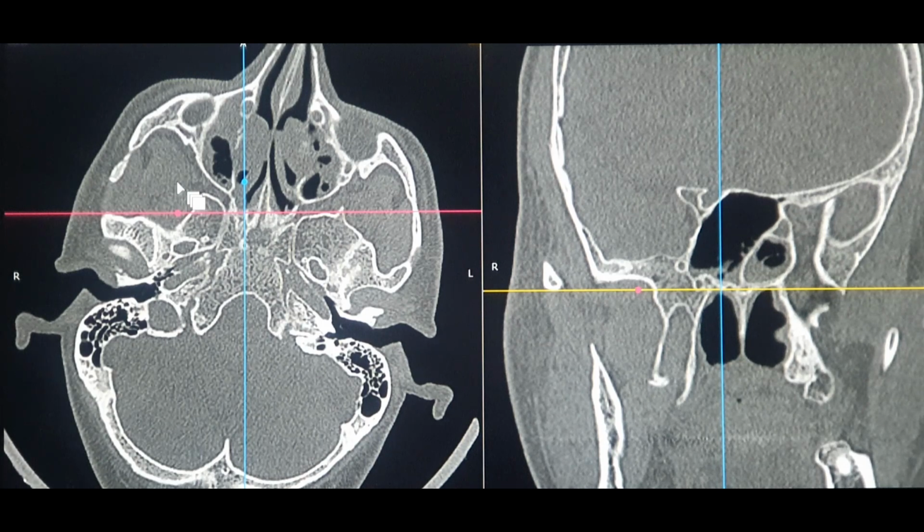If possible you can ask for 1 mm, but even better than that, to have a detailed study of the neurovascular bundle, are the 0.5 and 0.6 mm scans. They are really helpful for the little details that we need to understand as a skull-base surgeon and an ENT surgeon when it's concerned about the nerves and the vessels.